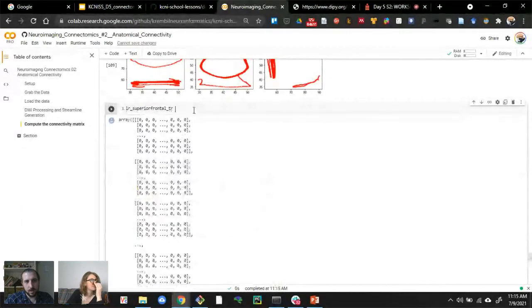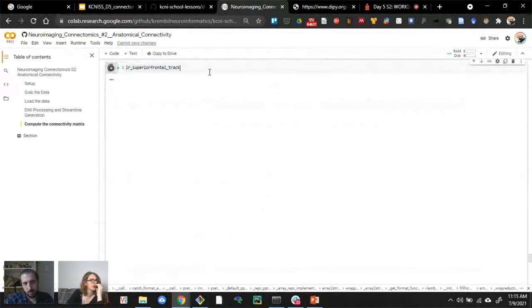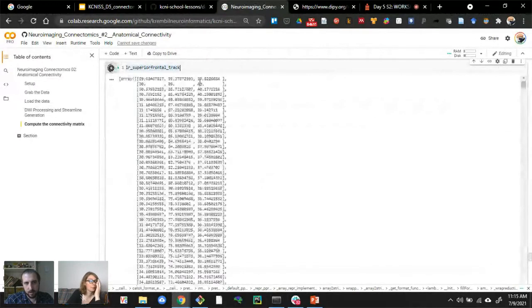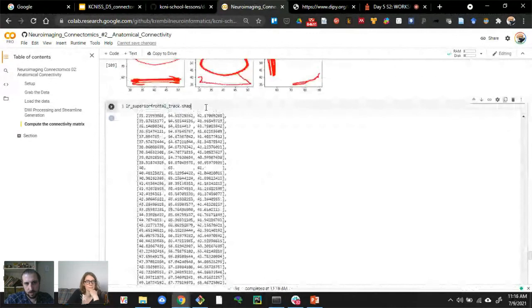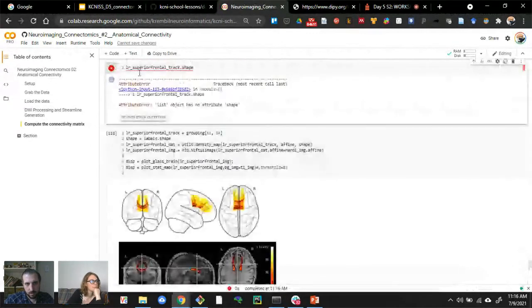Oh, I want to check. In fact, I'm going to guess it's going to be about 1,000. I just want to know the shape of this. Length of the list.